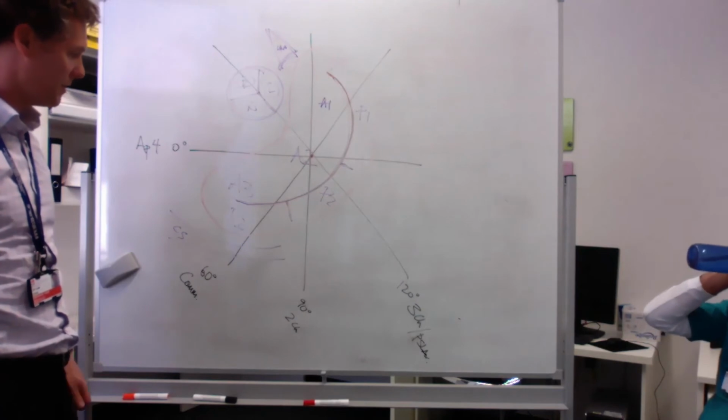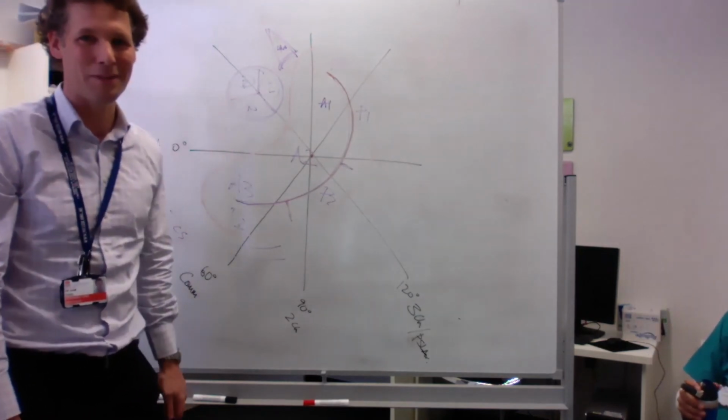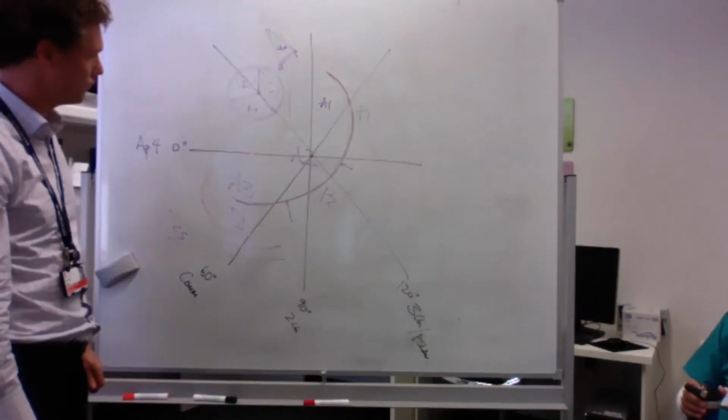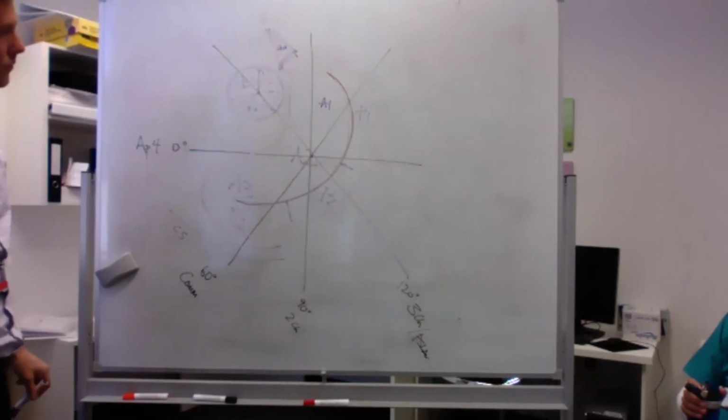I don't know whether I get it past all the other examiners, I'll be honest, but we'll see how it goes. So, the 3-chamber view, you get the aortic valve and then you will see A2 and P2.